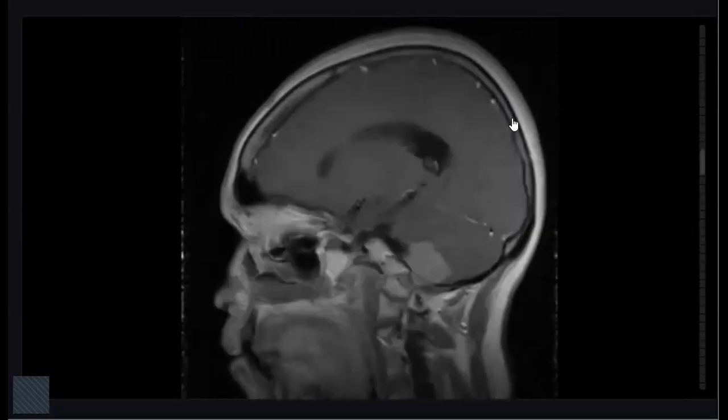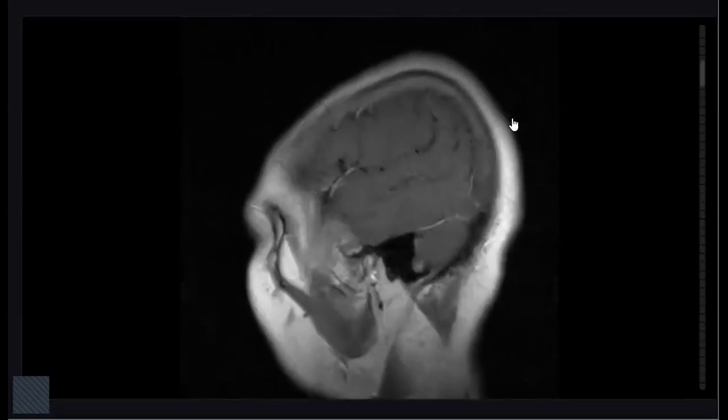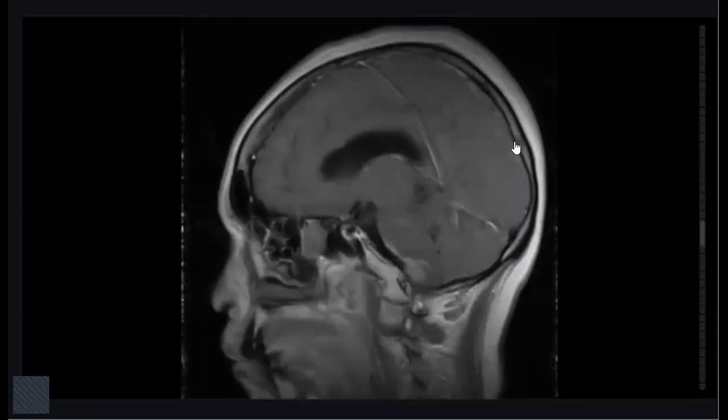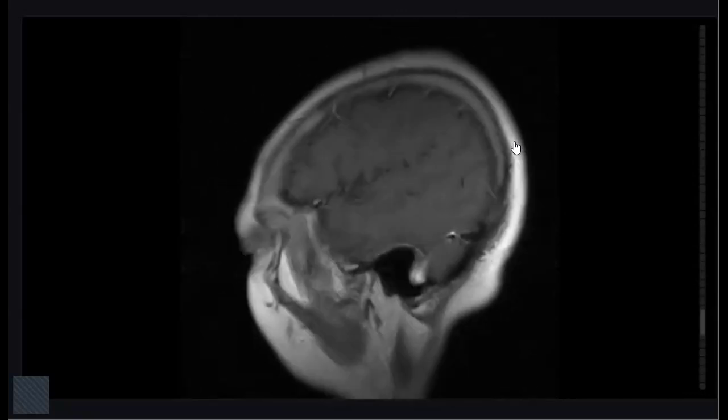So this mass appears to be extraaxial in origin. It reveals homogeneous enhancement, and this is a female patient with a history of lethargy. It is not associated with any large vasogenic edema. So these findings likely represent a slow growing extraaxial tumor, most likely meningioma. I will also want to see the coronal images and compare with the previous study. This patient needs neurosurgical review for possible resection of this tumor. This should be resected.